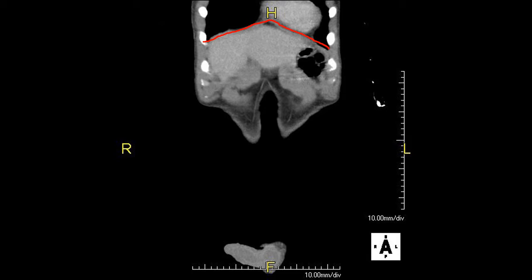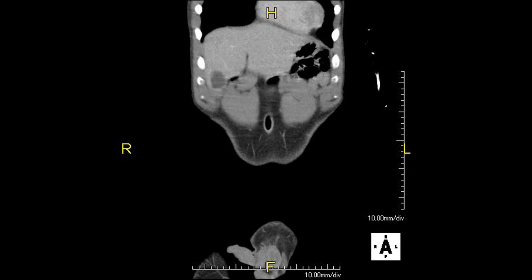You can see the heart in the thoracic cavity, and I'll just quickly mark that in yellow, as well as the liver below the diaphragm, and I'm going to outline the liver here in green. Now, the area that you see here, and I'll circle that in blue, are the contents of the stomach. There is a gray structure starting to appear next to the liver, and I'll circle that right here in blue. This is the gallbladder.